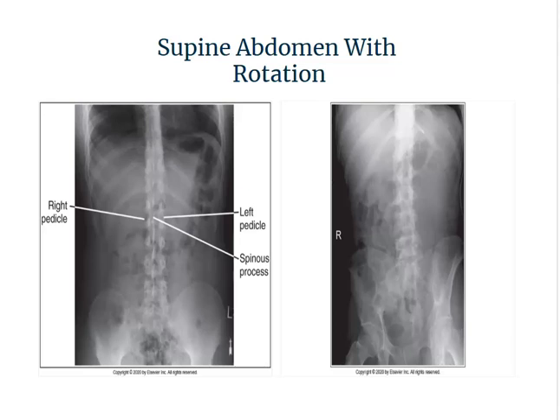When there's a shift or rotation, this eliminates subject contrast, which differentiates between the muscle and the fat when they're separated. This hinders the usefulness of the psoas major muscles as diagnostic indicators. So, how do we evaluate for rotation?